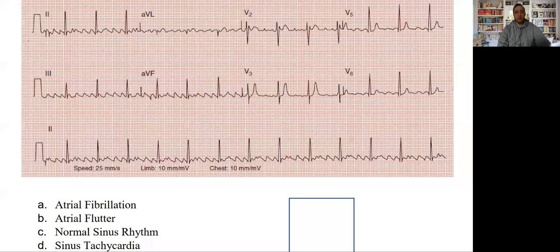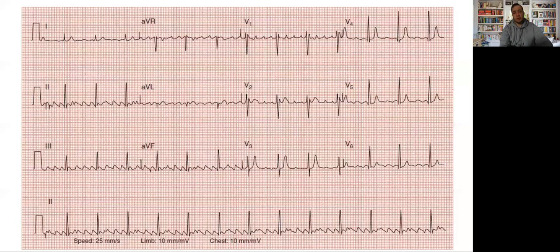When I read an ECG, you have to be systematic in the reading of the ECG. So here in this ECG, it's apparent what is called this sawtooth appearance. This sawtooth appearance is very typical for one of the common supraventricular arrhythmias. It's called atrial flutter.